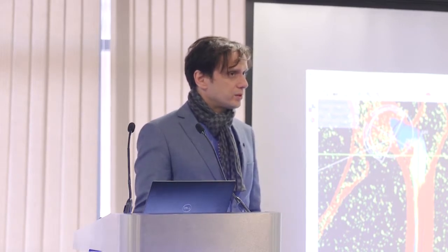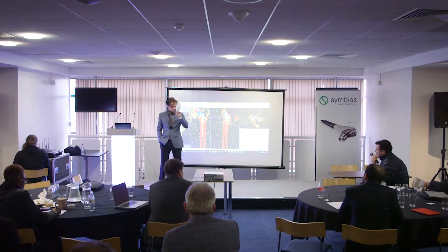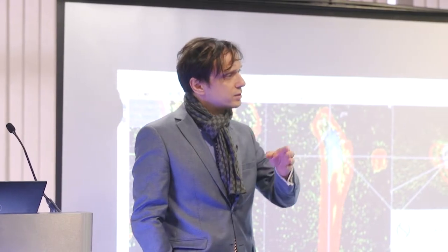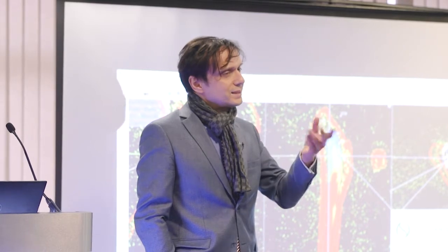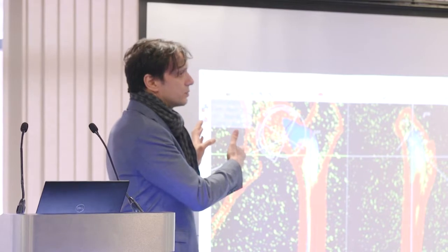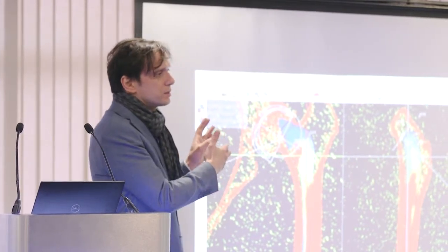So I would say if there is a lengthening, of, I don't know, X millimeters, I will tend to decrease the femoral offset. Not femoral offset, I will tend to decrease the global offset by the same amount. If I do +5, it's better to go to -5. But once again, it depends on the case. We really have to enter in the 3D anatomy of the femur and analyze what's going on. You know what I mean?